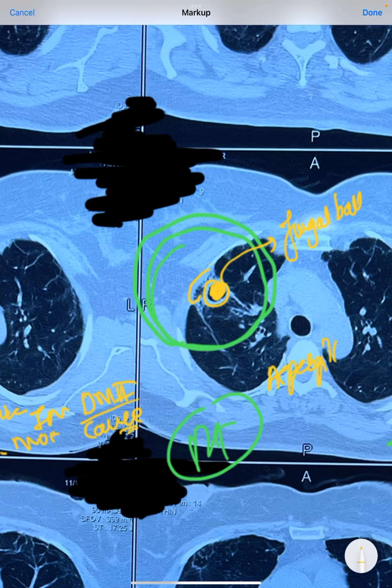because of aspergillosis. This aspergillosis is very common in those patients who have diabetes, who have immunocompromised status, who are on chemotherapy, who had an earlier history of tuberculosis which caused the cavity, or staphylococcus aureus infection which caused a cavity, and later it gets secondarily infected by the fungus, and this fungus then invades here.